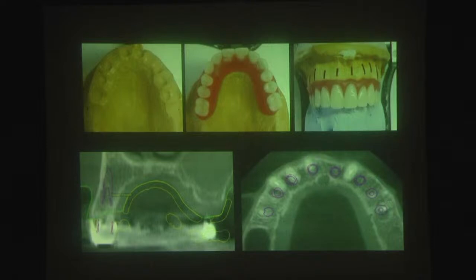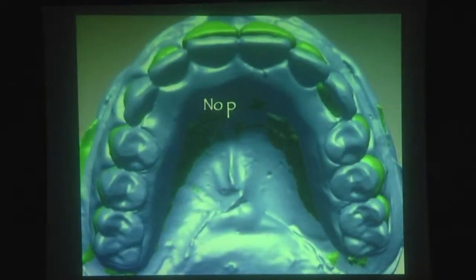So gently, gently, and after that, we made a wax-up model, which we can use if the patient wants us to perform that. We made a wax-up model. It is made of normal plastic, and this is just for making the diagnosis. And after it, we get the X-ray, we get the data from the DICOM data. I mean, we get some ideas from the DICOM data, and then we did something.